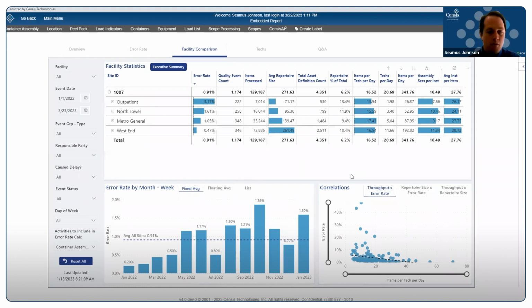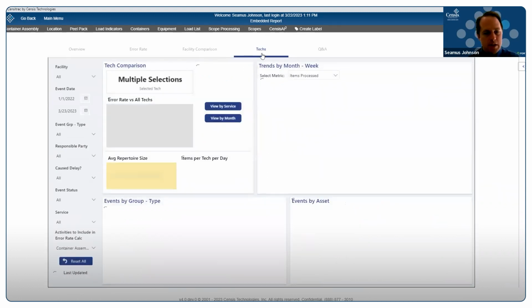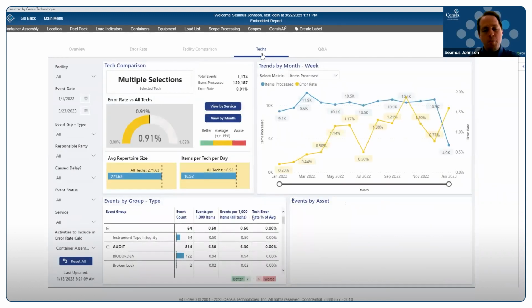The second thing, of course, is the proficiency level of your technicians. And here we've got some tools to help you measure that. You can see where you have opportunities for growth. And then you get a tab here based on the technician that helps you understand how to put that into action. You can filter this down to a single technician and you can go over with them.